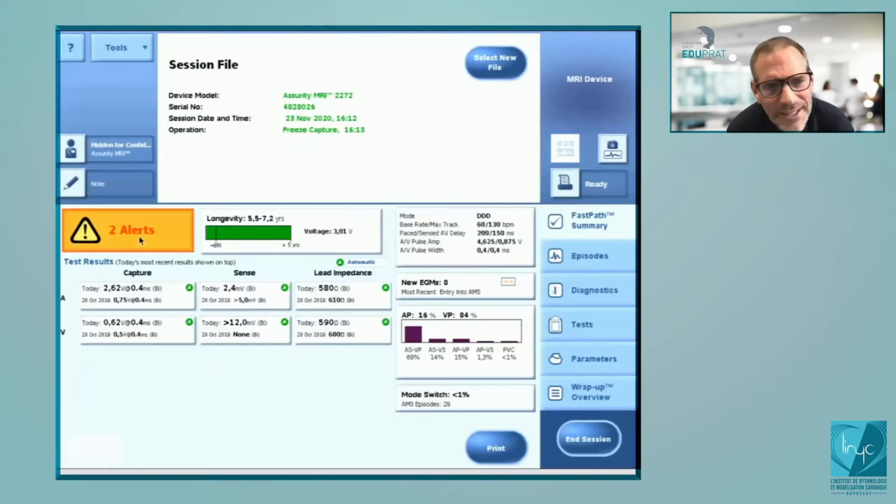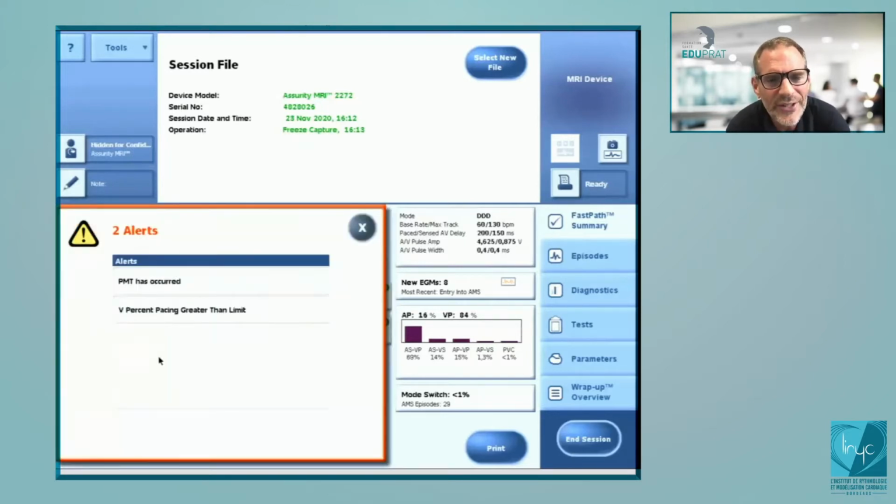That's going to be modified in the next version of the pacemakers and defibrillators. I don't like the word alert too much, because usually when I interrogate a device with a programmer, I like to show the screen to the patients. It's visual, and then you can understand the longevity, we'll see the duration.